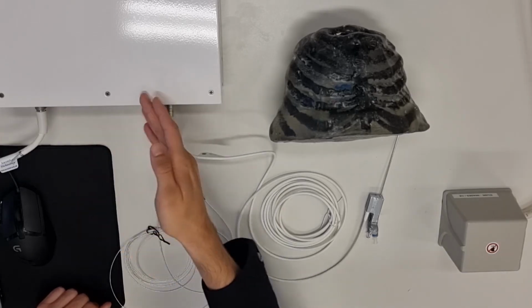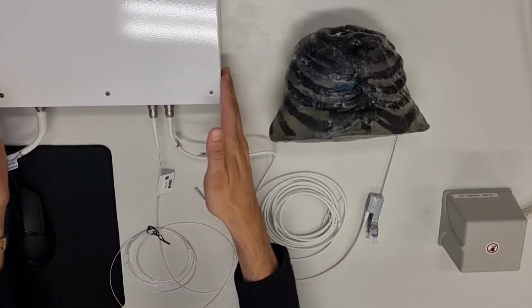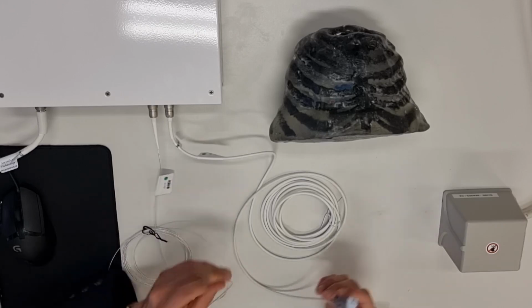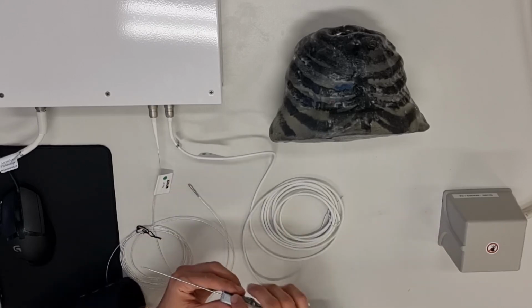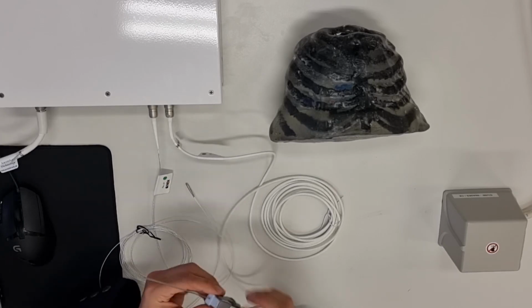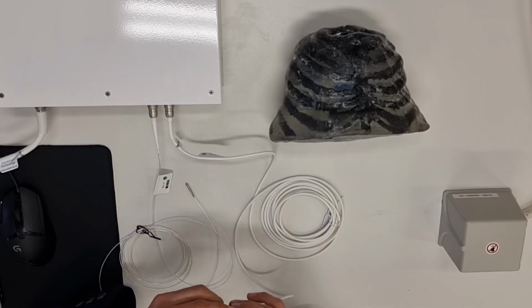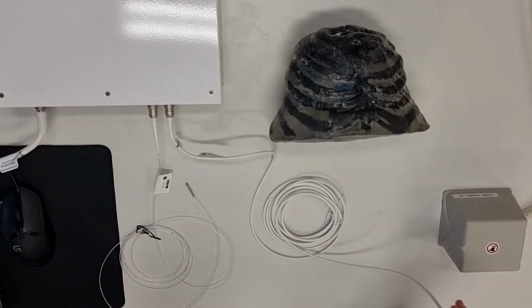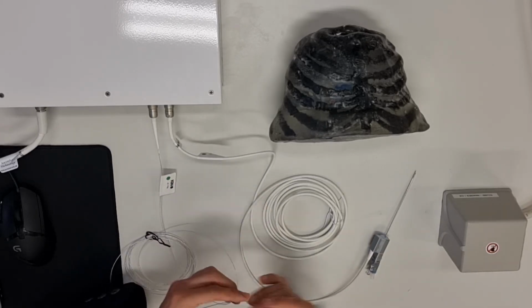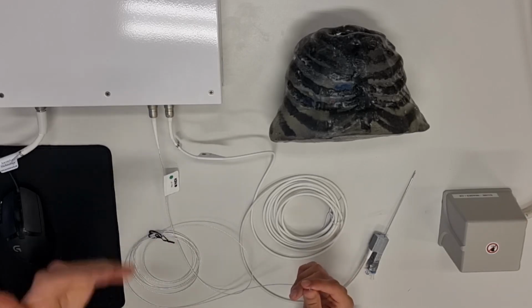Then we have here, as said, the EMT, electromagnetic tracker. It is composed of the main unit. Then we have here an emitter and two trackers. The bigger tracker is fixed to the surgical needle. We use the bigger one because it's the most precise one of the both, and it also has a bigger range of detection. The smaller one we use as our origin, world origin, to which we track all the points.